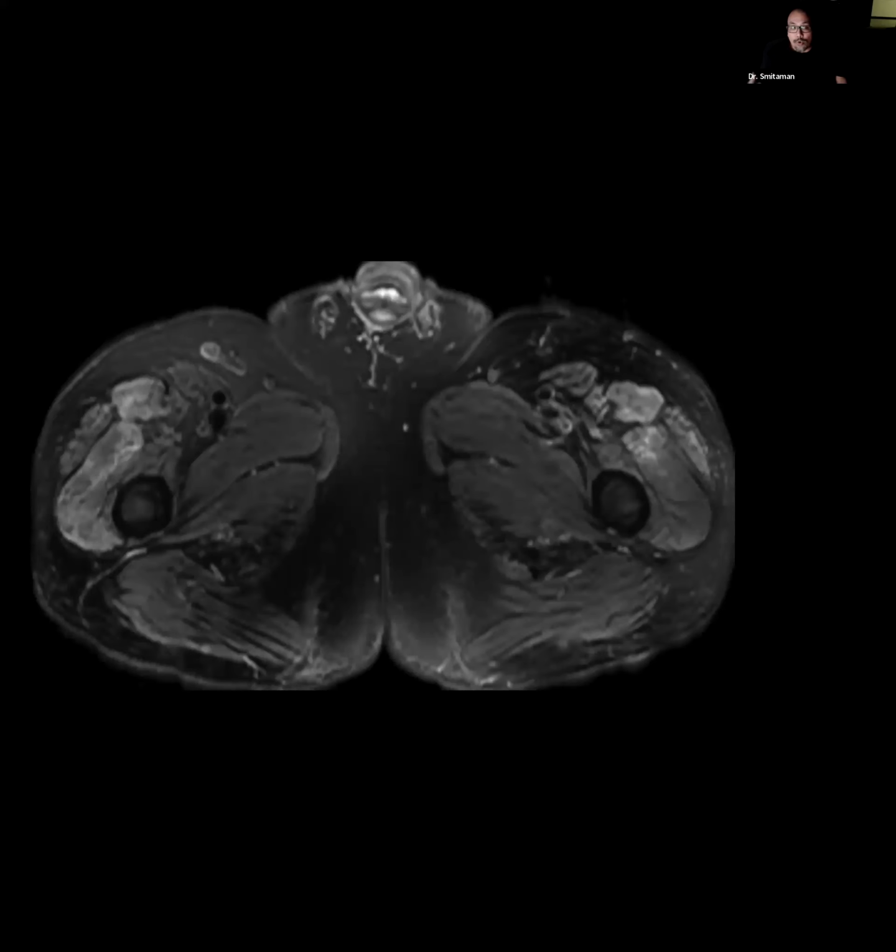Up to a quarter of patients with rheumatoid or lupus can demonstrate myositis, muscle necrosis, or inflammation of various connective tissues. And on MRI, obviously, this case here with a connective tissue disease, indistinguishable pretty much, but to a lesser degree, obviously, from the previous case of poly or dermatomyositis.